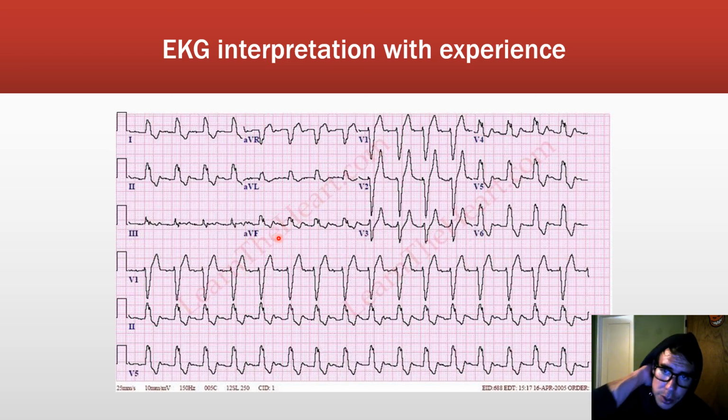They do have a left bundle branch block, which, in order to rule in or out heart attack, you need to follow something called Sgarbossa criteria. Along with the rhythm, that makes the inverted T waves, like I said, not really diagnostic in any way, because it could just be from the wide complexes in the bundle branch block. But yeah, I'm going to call this junctional for now. Possibly a heart attack, but we need to follow Sgarbossa criteria due to left bundle branch block. And this person may possibly have hyperkalemia, so high potassium levels.